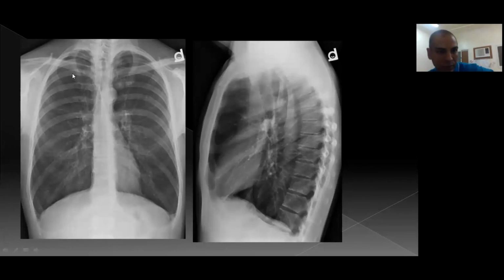This is the first rib, second, third, fourth, fifth, sixth, seventh rib. The 7th rib should intersect here at the midpoint, but it intersects the diaphragmatic copula more laterally. So the diaphragmatic copula is displaced downward, and as you said, it is flattened.